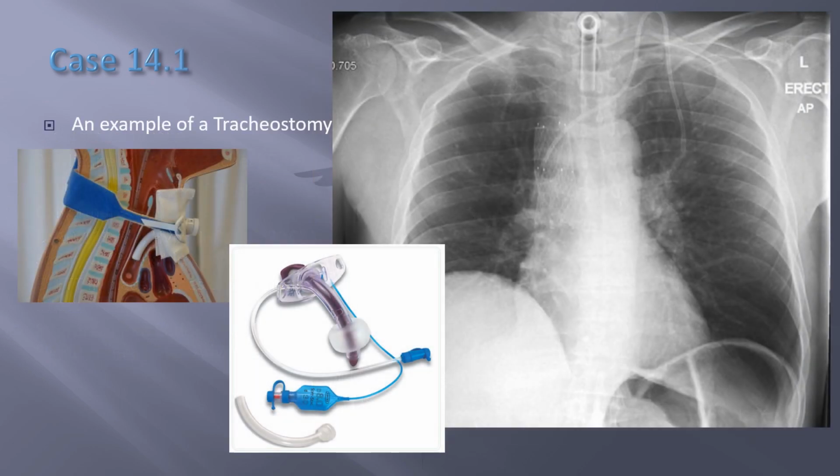This is another airway. It's called a trachea or tracheostomy or trach. It's in place of the temporary breathing tube that we've been seeing lately. This is a little bit of a side profile on it. So it just goes into a surgical incision. A stoma is created in the trachea, and then this airway device is placed in and then secured around the neck with a neck tie. And this is what it looks like outside.